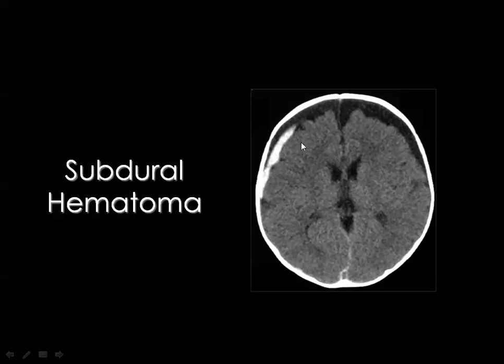You know, the CSF is present in the subarachnoid space, but in some cases of trauma, there may be tear of the arachnoid membrane, resulting in leak of CSF into the subdural space, and this will lead to the formation of the subdural hygroma, which is one of the traumatic sequelae. And the trauma also may cause bleeding in the subdural space or in the epidural space, but here you see the subdural hygroma, CSF-like collection, and the subdural hematoma as well.